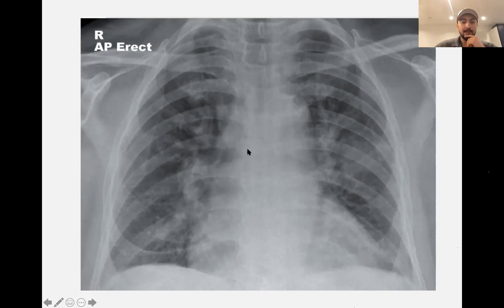And if you look at B, which is breathing, so you're looking at basically the lungs. So in this one, you can see the lung markings extending all the way to the edge, but you can also see some patchy opacification in here and in here, and that is a sign called bat wing sign, because it kind of looks like a bat.